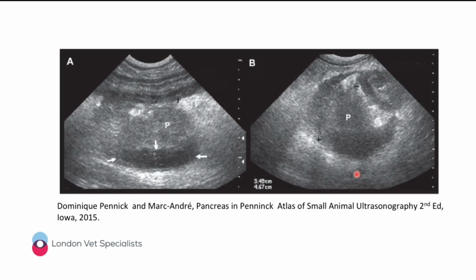So it's very difficult to differentiate that from, say, a neoplastic lesion. So something like a pancreatic carcinoma might look very similar. So you really do need to stick needles in these to be confident that they're abscesses.